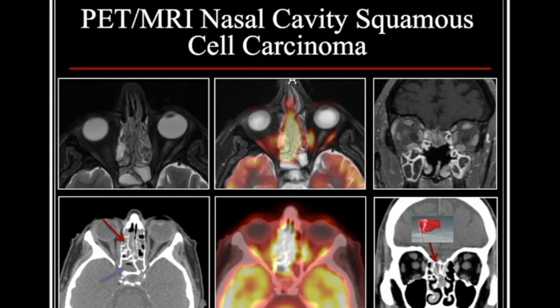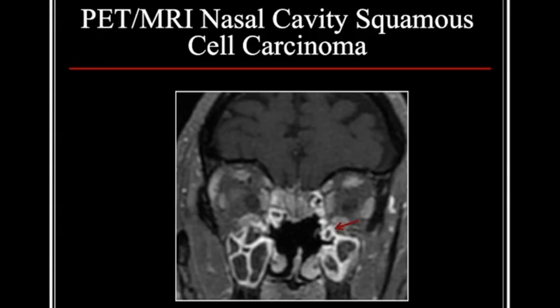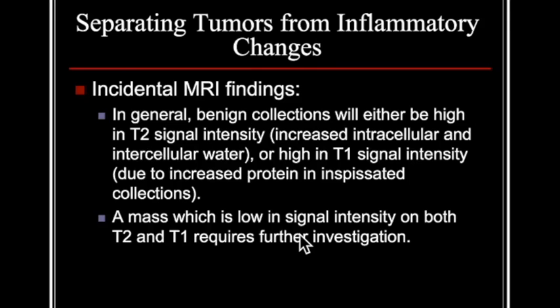This actually turned out to be a squamous cell cancer, which even on magnified views here, we can see extending up through the skull base and involving some of the dura just along the cribriform plate. So that's going to require a little bit more of a resection than just the initial resection that you can see occurred there before they did a full, more complete staging workup.